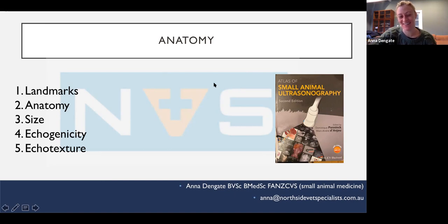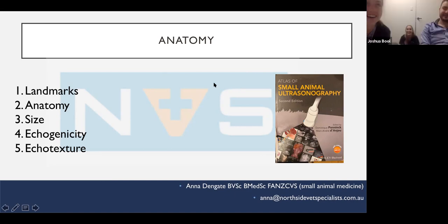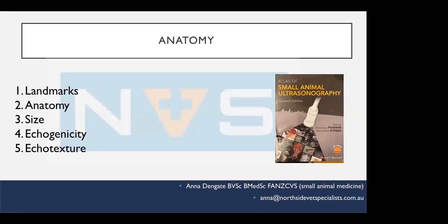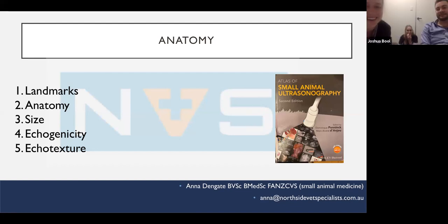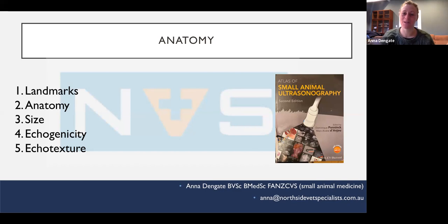And should it be darker or lighter? It should be hypoechoic, darker than the hyper. Well, the liver's in the middle, remember? Spleen, liver, kidney. It can actually be isoechoic as well, if that's allowed.